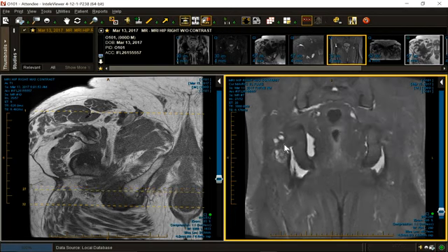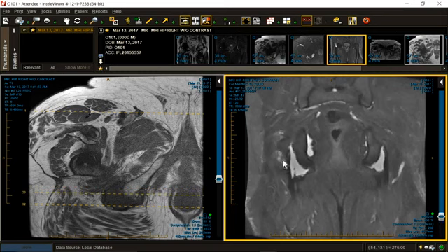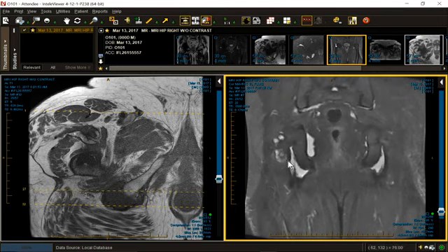We see a septum here. We see a body here. We see some gray signal inside. This is what particulate material looks like. It looks like irregular, disorganized synovium, but this is particulate disease, not metallosis disease.